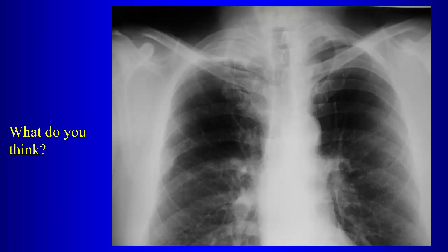There's a normal chest x-ray. We're going to dictate, besides the fact that the lower portion is collimated off, as Jose is going to point out to us. But are we going to dictate this as a normal chest radiograph? Next case. Thinking of the right lung. All right, certainly. All right, so say this to yourself 3 times.